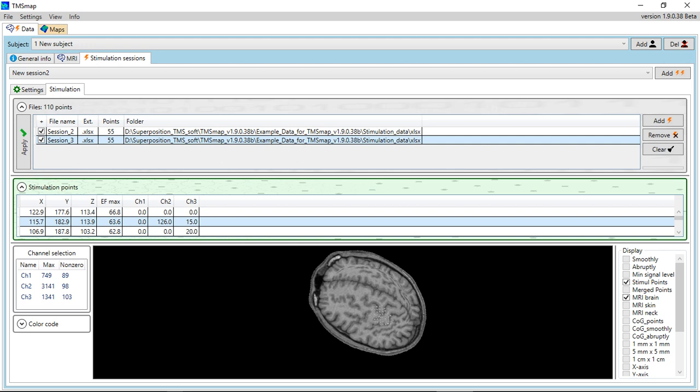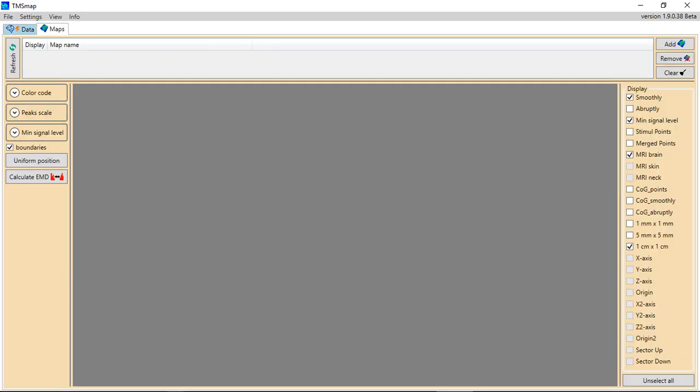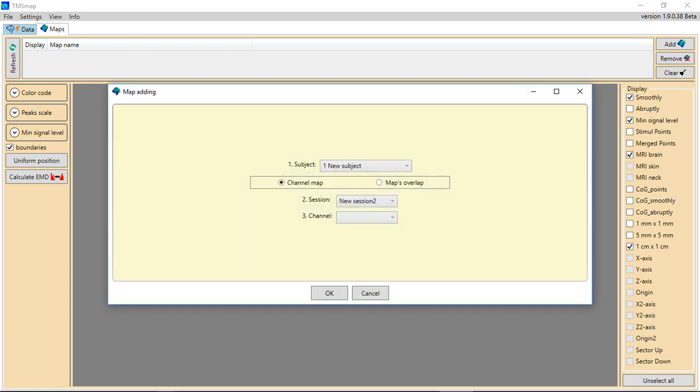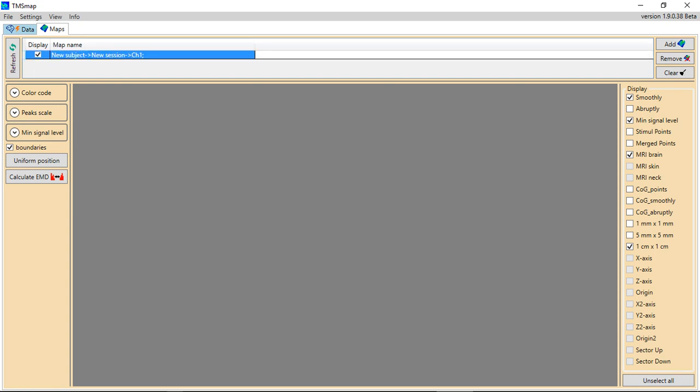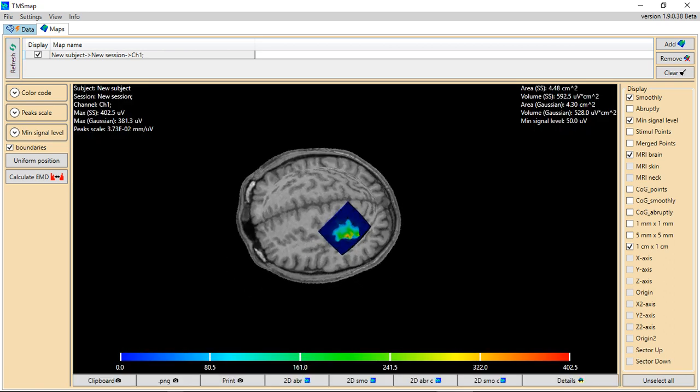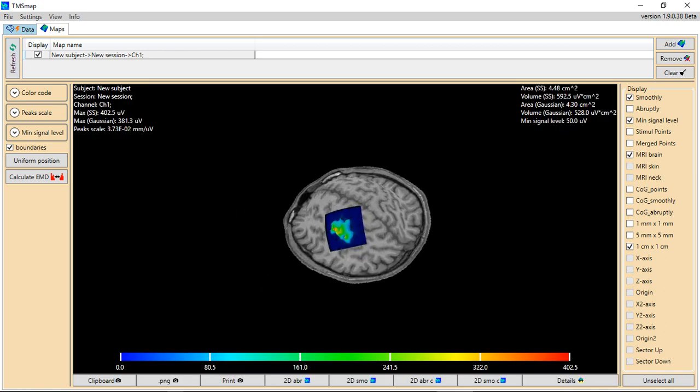Okay, and now I go to the maps window. Okay, here we can really construct the map. Let's say we start with this first new session, channel 1. It will appear here. It will take a second. Yeah, I can press refresh, and I will see this on the screen.